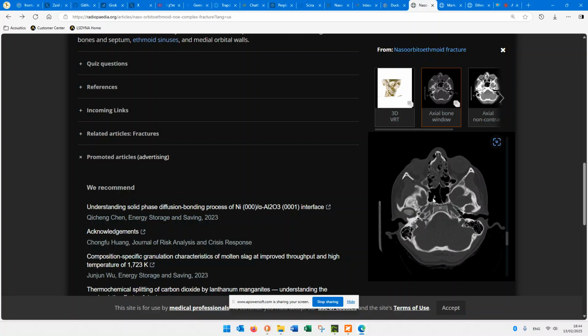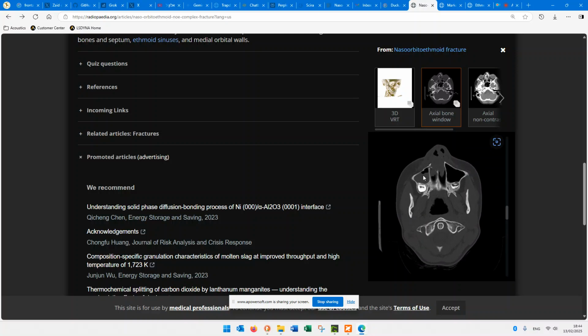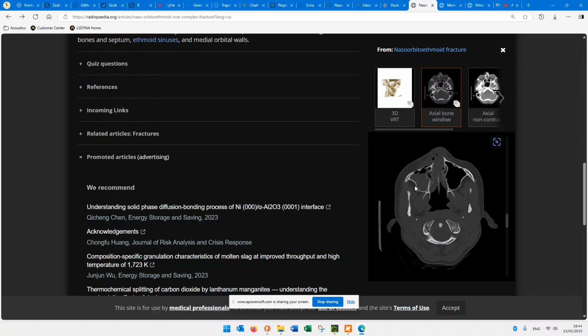Let's go to the fracture. Here it is. You'll see it right over here. You can see some air and fluid, or isodense material, in the maxillary sinus, below the floor of the orbit. And you can see here the fracture and air bubbles that go around it. Compare it to the contralateral normal maxillary sinus. You will see the fluid, maybe it's blood, I don't know, and the air and the fracture right over here.